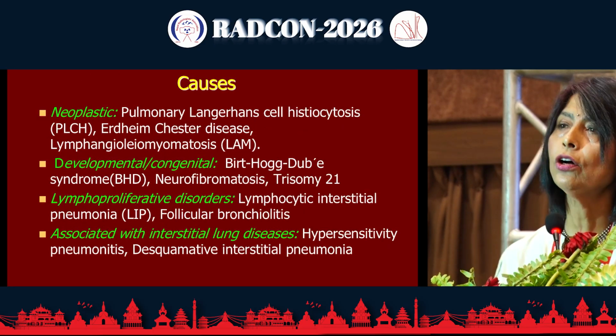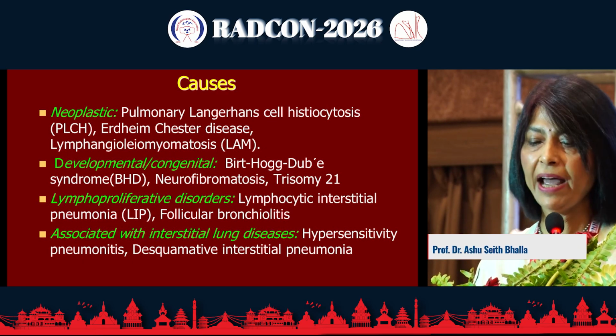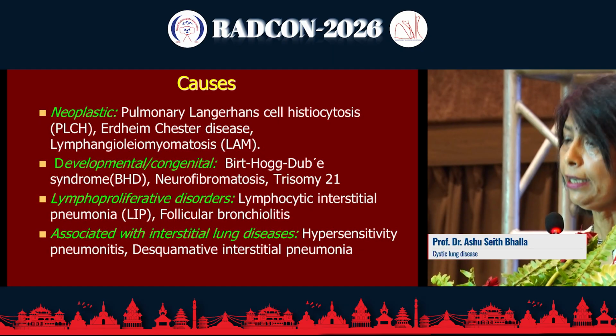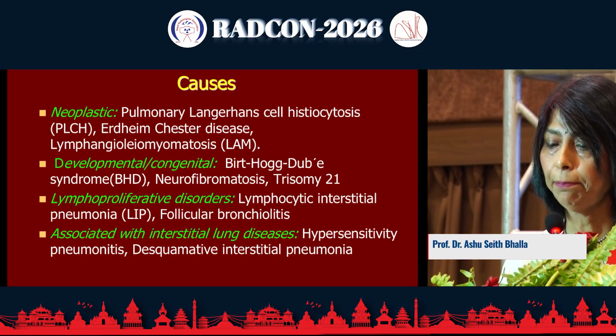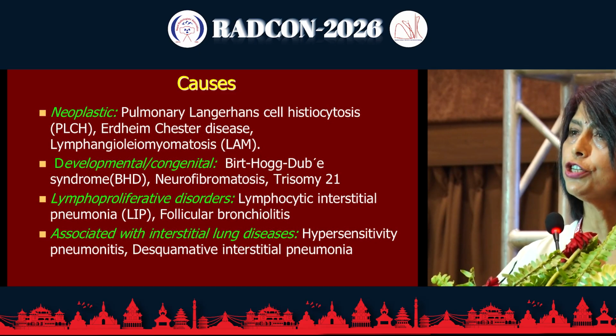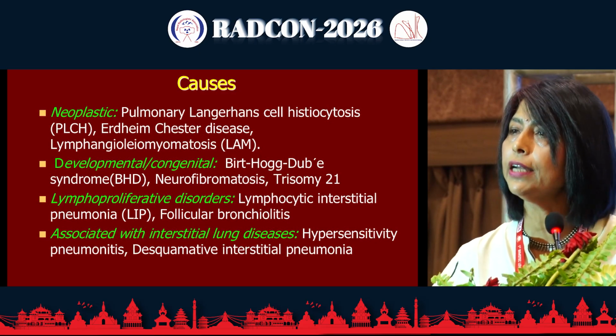Then again, that nodule versus nodular pattern, cyst versus cystic lung disease. When cysts are the predominant pattern, it becomes cystic lung disease. The causes are really diverse.